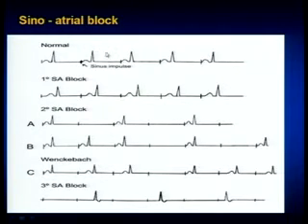Unfortunately, in an AV block, you can see the atrium represented by the P wave and the ventricle represented by the R wave. Here, the depolarization of the sinus node is not represented in the ECG. So when you have a prolongation of the conduction from the site of impulse formation to the atrium, it is not manifest in the surface ECG. So in third degree SA block, when you have dissociation between them, usually it presents as junctional rhythm and it cannot be diagnosed on surface ECG.